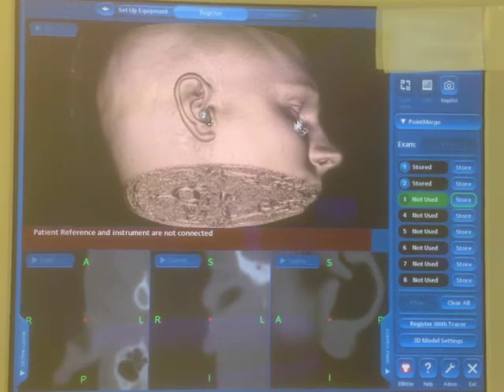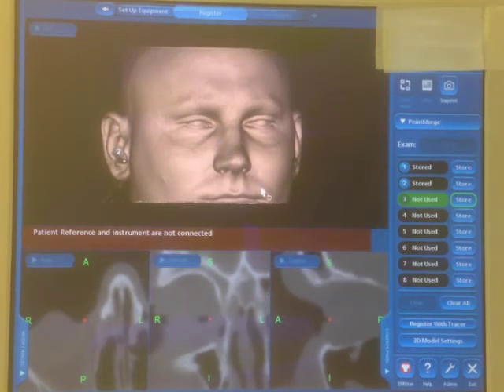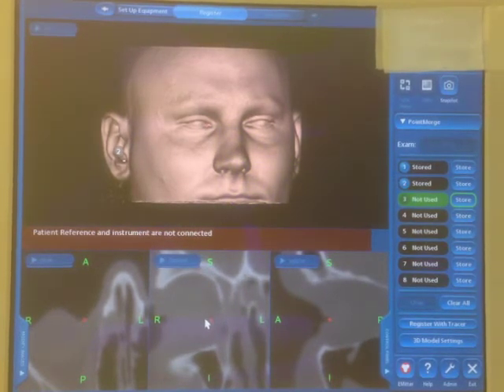Next one we're going to do is the medial canthus. This is a nice scan. You're going to pick right on the caruncle is what you're aiming for. You look here on the coronal, and you're going to choose on the axial and go until that air pocket disappears right there. And you can verify right here that you have a really nice selection of the caruncle.